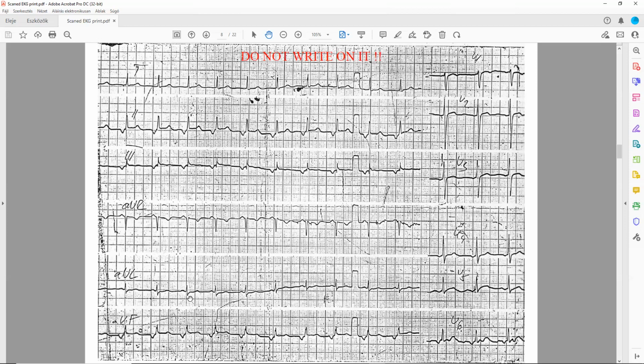Well, okay, yes, you are right, because AVL is exactly perpendicular to 60. Yes, it can be around 60. However, lead number 1 is bigger than lead number 3, so I would say around 50, a little bit closer to lead number 1. Okay, that's great. Thank you very much.